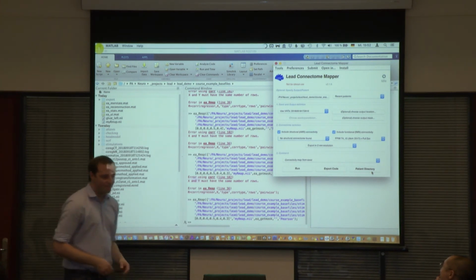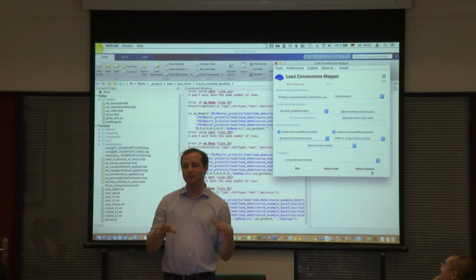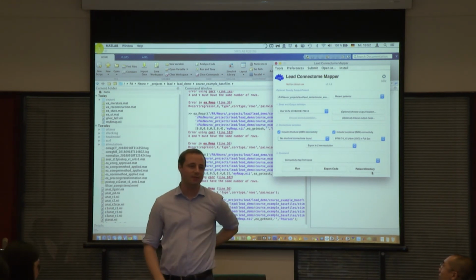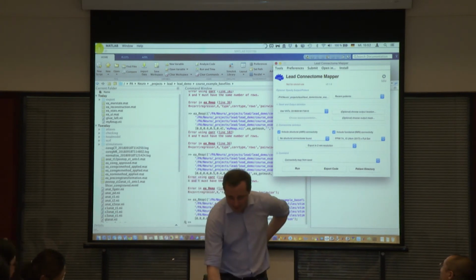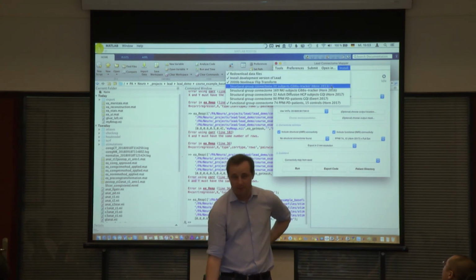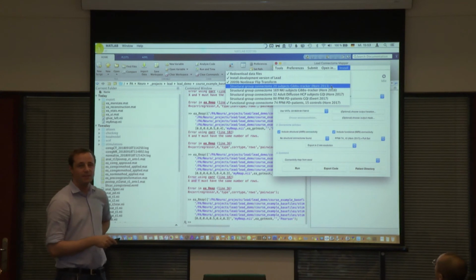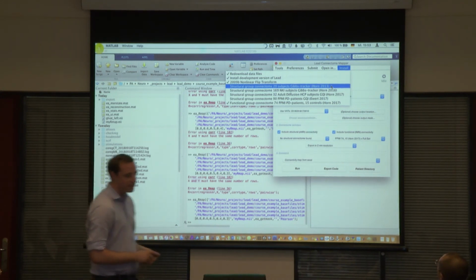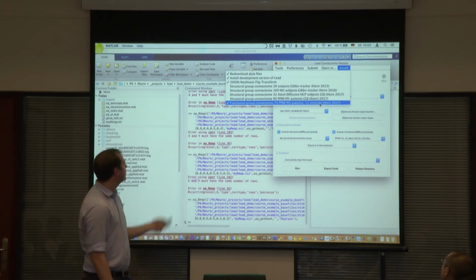Okay. That was that. Any questions? Do you think you've understood the concept, or do you want to try yourself more? And important is that you can install these connectomes here, right? So most of them are just downloadable from the website. And as you can see, in my case, I just have this one installed currently, so the rest is lacking.